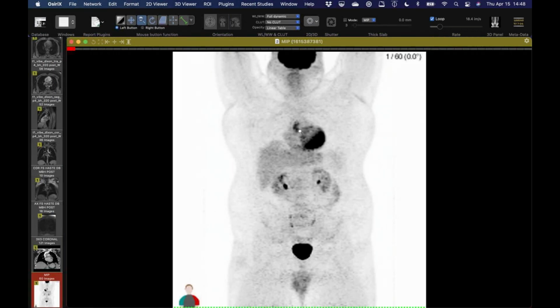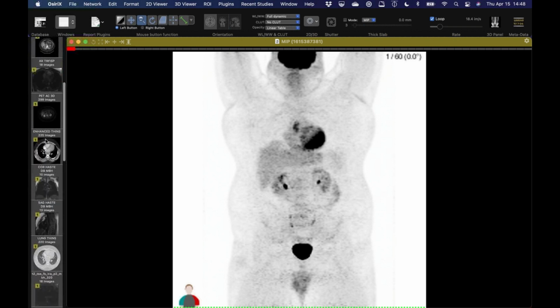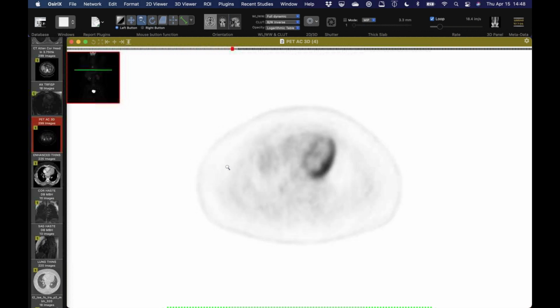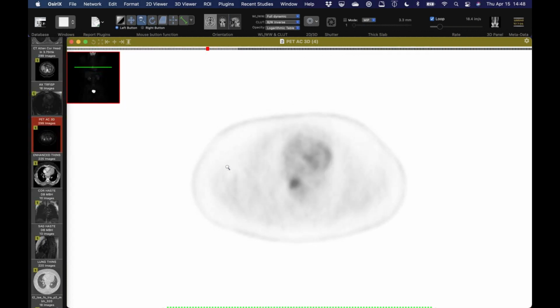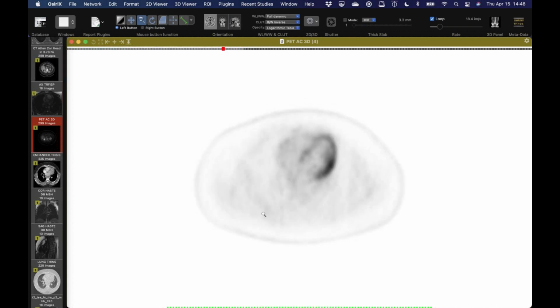In acute granulomatous infection, particularly histo, I have seen coxy do it in a patient who had been out in coxy country. But around here, it's usually histo, and they did a whole workup at the outside hospital. They did an MR, which I have all the sequences here. The only thing I'll show you that I think supports the diagnosis is there's a post-contrast T1 in here somewhere.